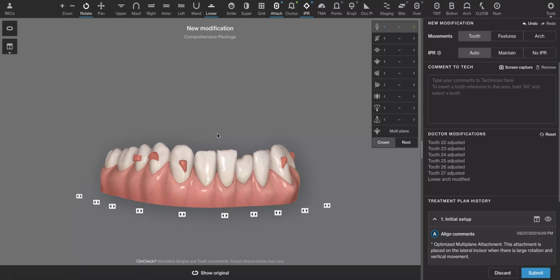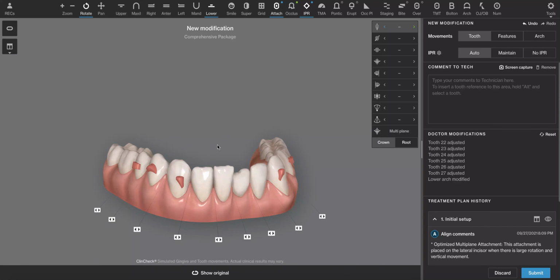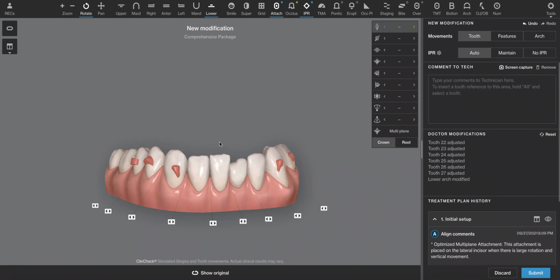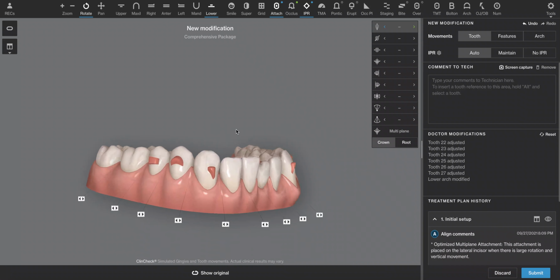If the patient doesn't want to do this, you say, sure, we can straighten things out for you. You're going to be missing a lot of the functional improvements that you could get. That would be a different price point. We can do Invisalign Express for that, but I really don't think I would even propose that to this patient. There's a lot you can help this guy with.